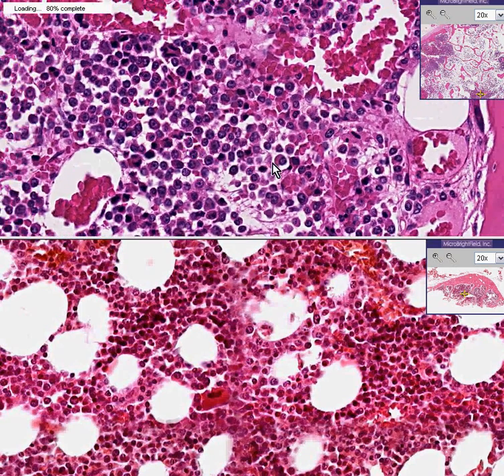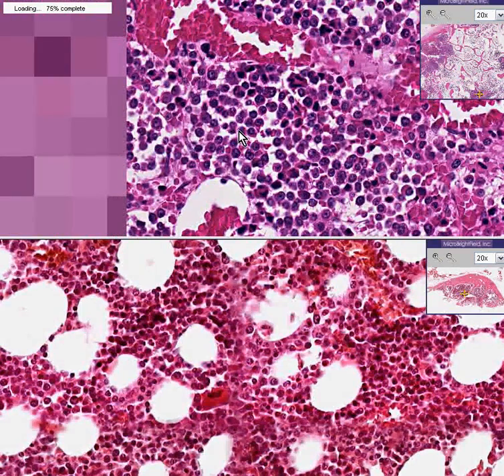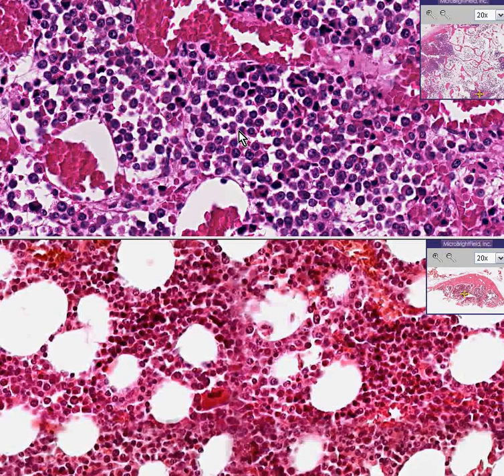And the thing about multiple myeloma is even though it's a destructive malignancy producing monoclonal immunoglobulin or immunoglobulin fragments, the cells themselves may look, in most cases, like totally normal plasma cells. In most cases. In some more advanced or worse differentiated myelomas, the plasma cells don't look like plasma cells at all, but usually they look like normal classical plasma cells.